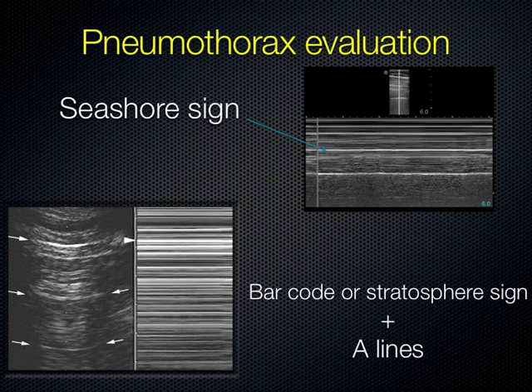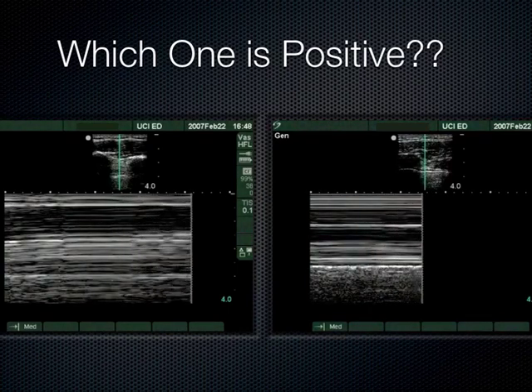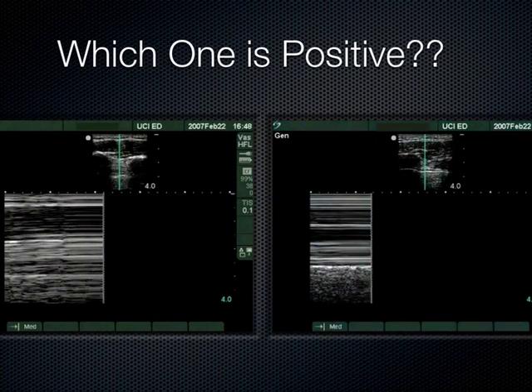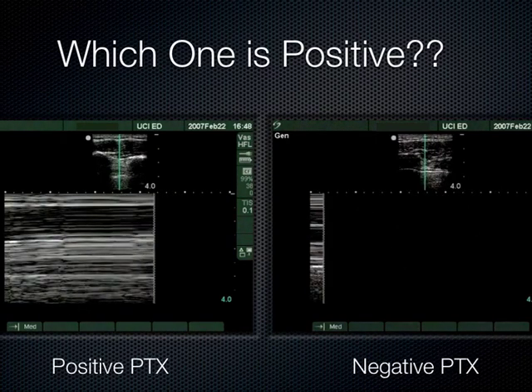And which one is positive? Right or left? Correct. Once you understand what you're looking for and you can find that image, not a problem. And last example, which one is positive? Left. Nice job.